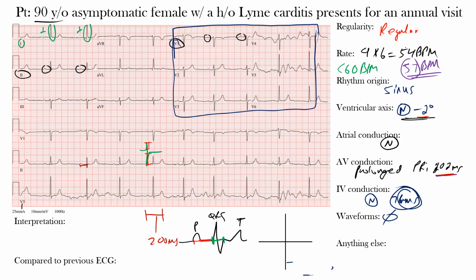So what we're looking at are these R waves. Okay, you can see them here that it slightly increases, maybe not so much when we get to V4, but then clearly in V5 it does, okay? And again, we'll say later that this is quite an imperfect science, so in general we would say this is pretty normal R wave progression here, okay? Now, how about the transitional zone in the precordial leads? Well, it seems to occur between leads V4 and V5.